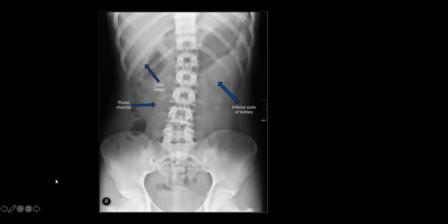So again, going back to our acronym, we've covered the bowel and other organs. We've looked at the difference between small and large bowel, but again, we've got other organs here to consider. So although X-ray and abdominal X-ray is definitely not the modality of choice for these organs, we can sometimes appreciate things like the liver, kidney, psoas muscles, stomach, and the spleen. And the stomach can often contain a varying amount of gas.